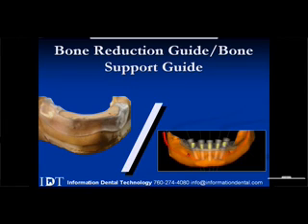we scan the radiographic guide by itself, and then scatter has no bearing on how we're going to fit and seat the surgical guide, because we're going to build the surgical guide based on the underside, or the intaglio side, of the radiographic guide. The gutta-percha markers will show up as long as they're placed below the crown. Then that will allow us to see the gutta-percha markers outside of the noise and scatter. And then when we merge it together, you're going to get something that seats properly, and the scatter is not going to have bearing on the surgical guide that we're planning.